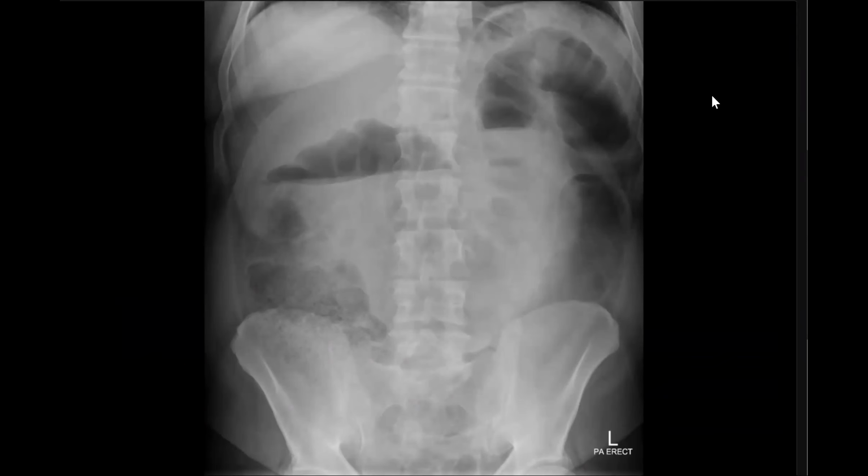Okay, this patient has acute abdominal pain. I'm presented with a frontal radiograph of the abdomen of a skeletally mature patient complaining of abdominal pain. I can see multiple dilated gas-filled small bowel loops, mainly on the left side of the abdomen. I do not see any surgical clips. I do not see any radiopaque calcular shadows. In my routine practice, I would extend.